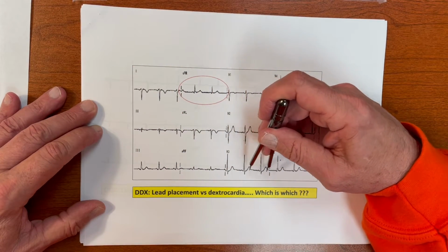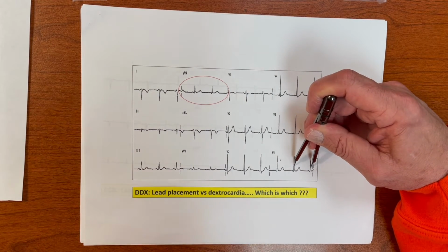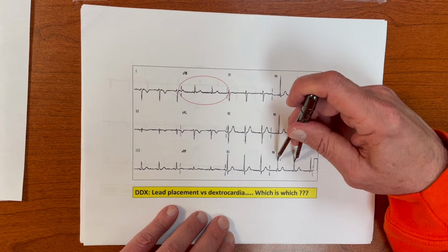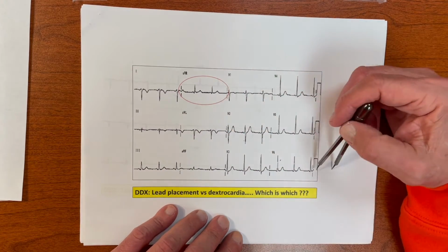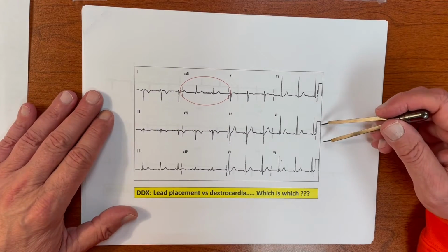So I have a regular rhythm. I'm going to screen for something bad, arrhythmia-wise. So I have a regular rhythm, and then I'm going to multiply the number of QRS by 6, and I got a good rate. Go here to my standardization.